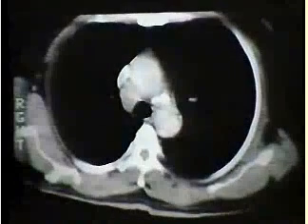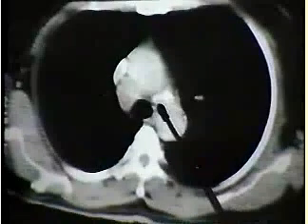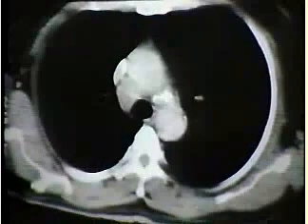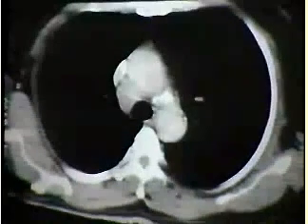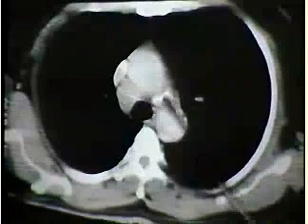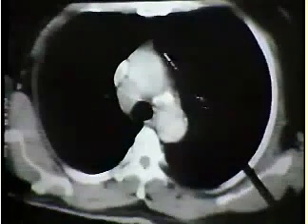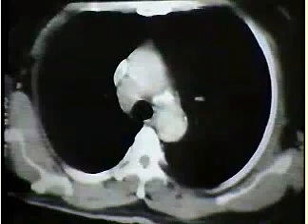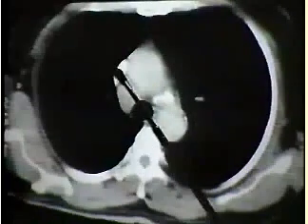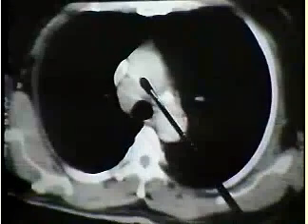We start near the level of the aortic arch, ascending and descending with a little bit of calcium in the bottom of the arch. The superior vena cava, notice the contrast material in the superior vena cava is a little bit eccentric because of the flow, presumably from the left brachiocephalic vein, not having mixed completely with that from the right, so that the contrast is not uniformly distributed. Now recall there's supposed to be a fat pad between that vein and the trachea, but in this patient there's a soft tissue mass.